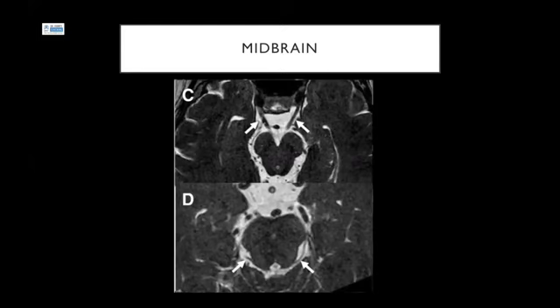So we're at the level of the midbrain, and here we can visualize the 3rd cranial nerve, which is the oculomotor nerve, and the 4th cranial nerve, which we can see coming out, which is the trochlear nerve, arising posteriorly out of the midbrain. So oculomotor nerve, the Mickey Mouse shaped midbrain, oculomotor 3rd nerve, and then trochlear nerve coming out more posteriorly, and it's a smaller nerve.